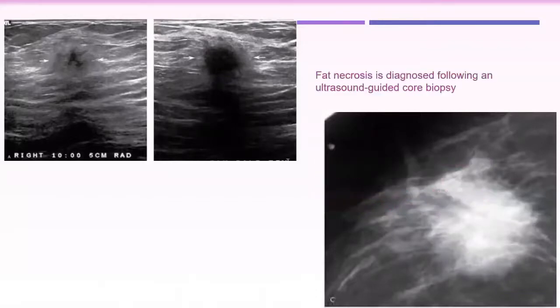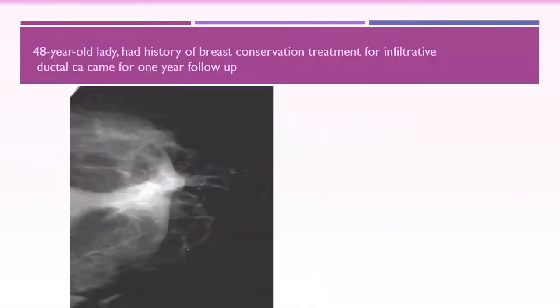Proven by ultrasound. They had done ultrasound and found fat necrosis, and they followed the patient. The patient came on follow-up with the lesion almost completely resolved. Okay, this is our patient. You have seen it before.